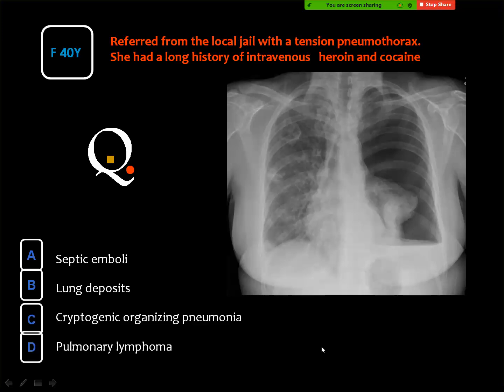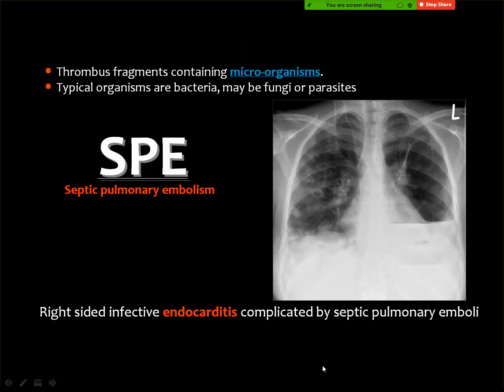Incidental finding? Erosion. Now, pneumothorax is common in such cases because rupture of one of these cavities into the pleural space will lead to the formation of pneumothorax and also some of the pus in the pleural cavity. Then septic emboli appear in the chest as cavitating pulmonary nodules. They may be associated with pneumothorax or pleural effusion or hydropneumothorax.